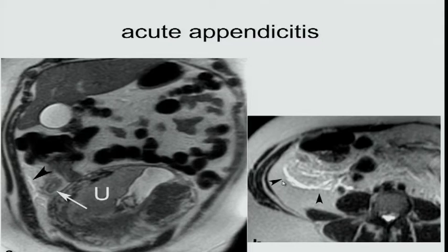So is this the single shot fast spin echo that we're looking at, or what is this? What are we looking at? STIR. Right. We're looking at a STIR or a fat sat.